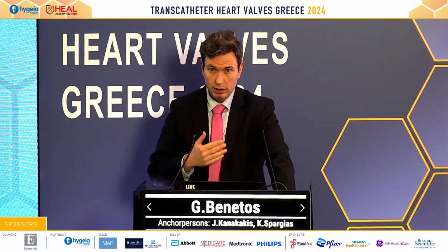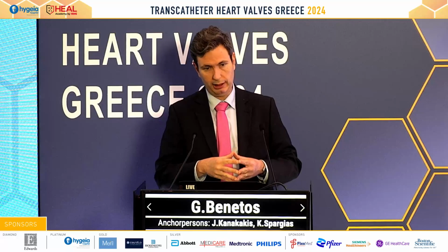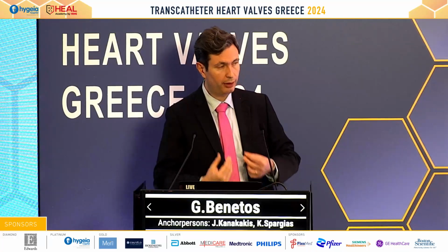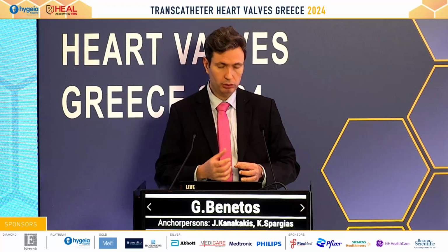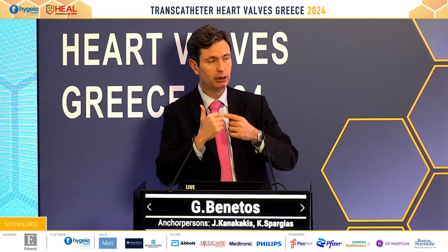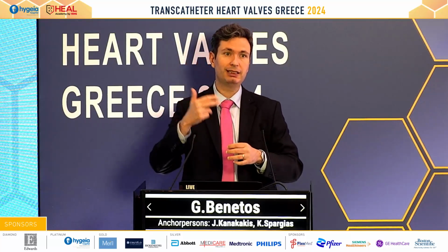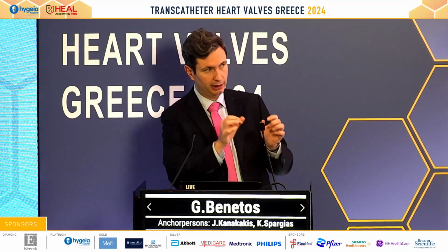Regarding the second question, perhaps I forgot to mention it, but in order to examine exactly what's the danger, what's the risk of coronary obstruction, you have to do a virtual implantation of the valve. That makes the software, so either with the shape of Evolut or Edwards, or a ring is virtually implanted inside your annulus, and then you can measure the virtual valve to coronary distance. So the virtual distance, the distance that will come if you implant this specific size of valve in this specific annulus.